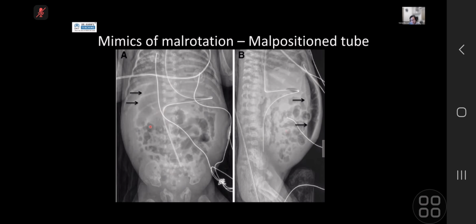Other things you think about, you can also have, let's say, a big renal mass that's displacing your DJ flexure, which I haven't shown here, of course. And if you've got scoliosis, your DJ flexure position can also change. So remember, even though on fluoroscopic study the DJ flexure looks malpositioned, there can be other reasons to cause it.